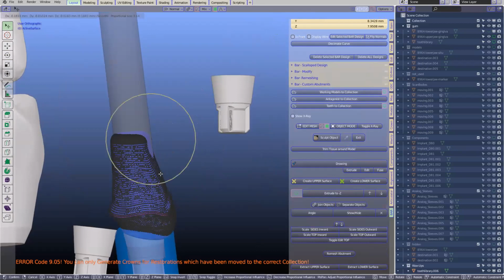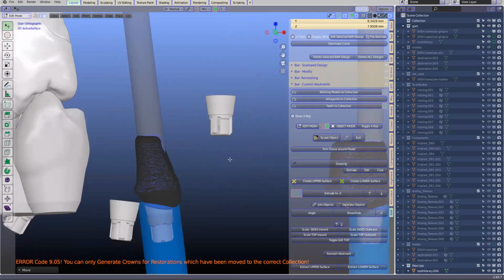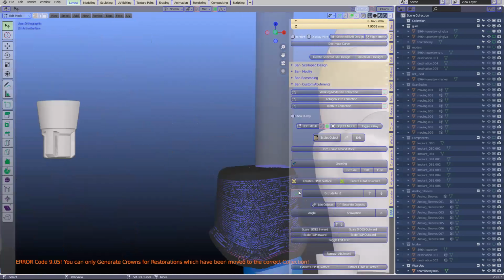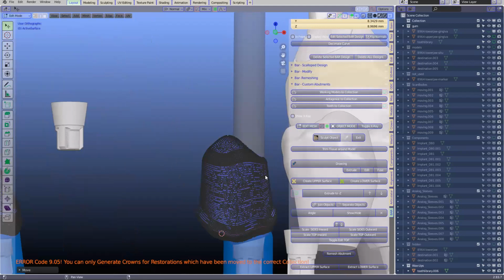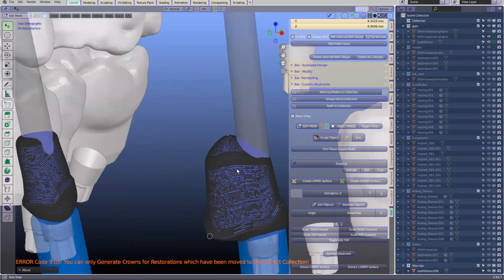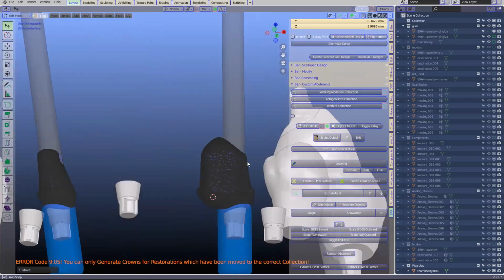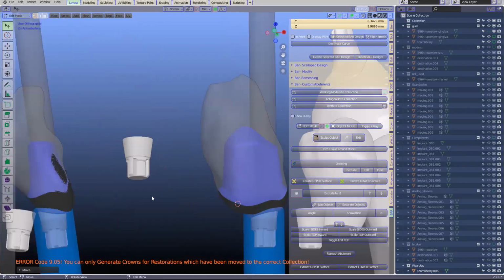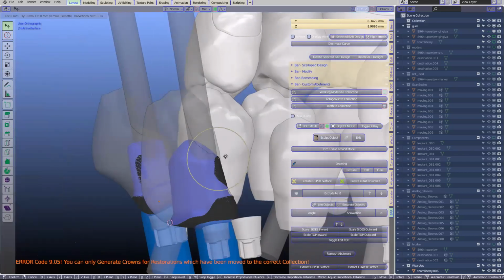What about incisally? Can you pull the other tooth up a little bit? Yeah, you just select and then GZ. So this is the reason the whole abutment is remeshed, so that you've got a good mesh structure to pull, push and do whatever we want. If you had a molar dipping onto your abutment, you could actually sink the occlusal table as well, can't you?